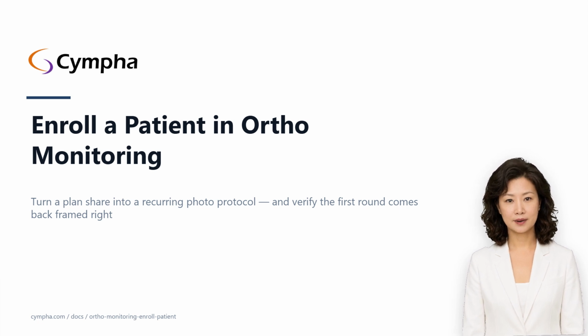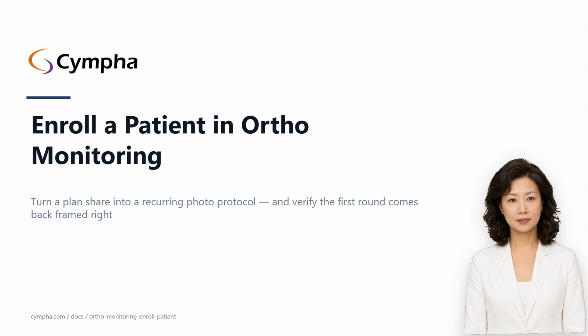By the end, you'll know how to share an aligner case with a patient as a monitoring subject, how the patient captures their photo rounds on a phone, and how to verify that the first round came back framed correctly, plus the 2 numbers you should hand the patient before they ever open the camera. Plan about 5 minutes for your first enrollment and 30 seconds per patient after that. Follow along on screen, or just listen now and read the written guide later.